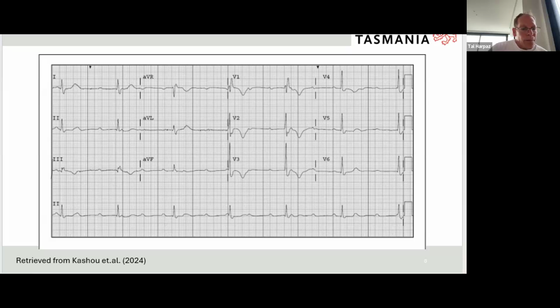It's variable. Variable? Yeah. Agreed. For both P's and QRSs? The distance between the P and the R is variable. And what about the distance between the P and the P and the R and the R? So the R and the R are regular, but the P and the P are irregular, if that makes sense. Yeah, absolutely. And what does that tell us?